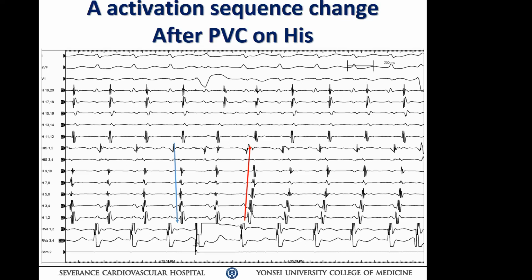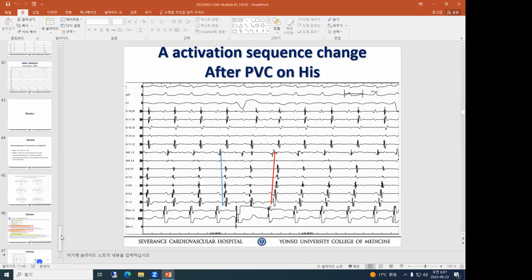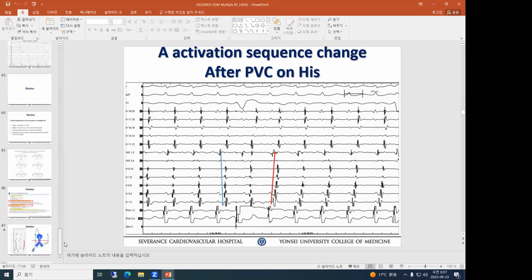Okay, let's discuss this EGM. Can you explain the mechanism of the sequence change by V extra? Actually, I have one slide at the end of the presentation that explains this. Okay, so I explain now? Okay.